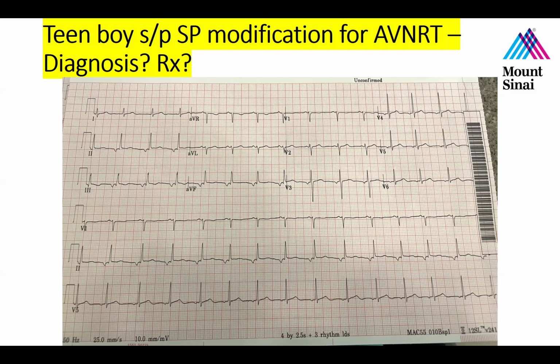So looking right off the bat, it appears that we are not in sinus rhythm. This is based off leads 1, 2, and AVF.